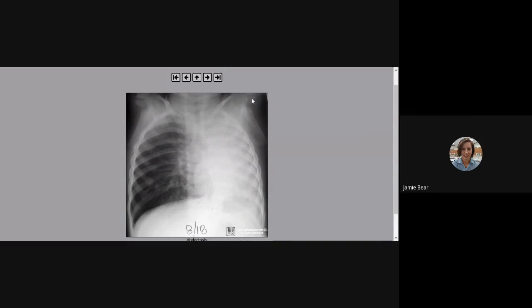And it's good because a lot of times the radiology techs will actually, like you can see right here, there's a little label. So a lot of times they'll have a label that would say left and that would say right over on this side.